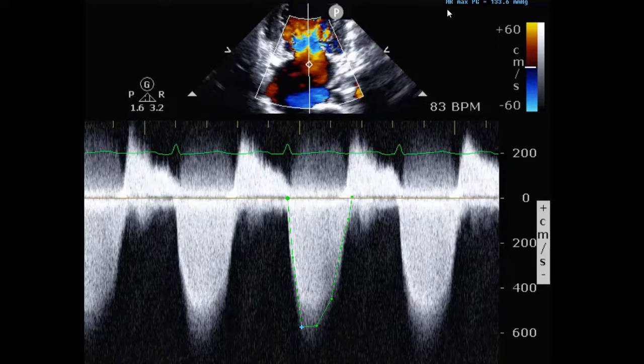However, the mitral mean velocity here is 392. VTI is 162.5 centimeters. Mean gradient, MR mean gradient, less important, so I won't mention that. So the key elements here is that the mitral valve VTI is 162 centimeters and the Vmax here is 577.8 centimeters per second.